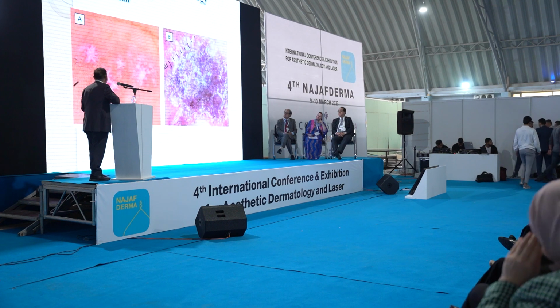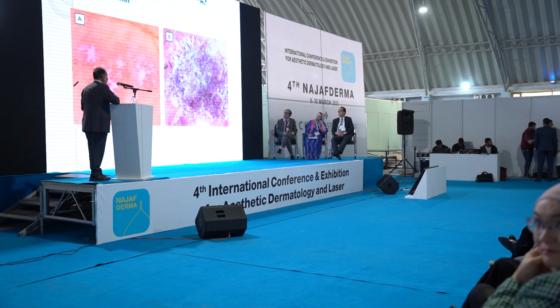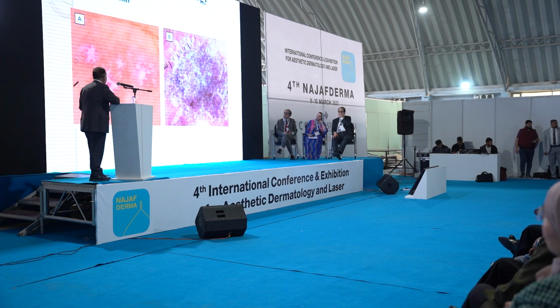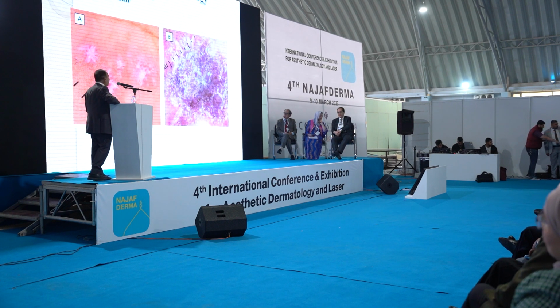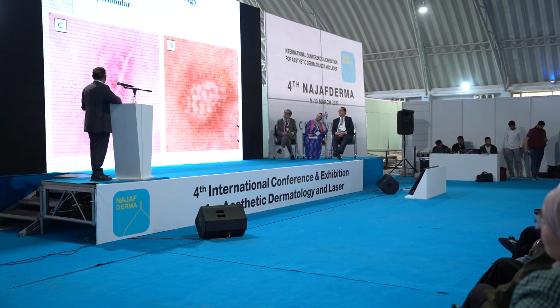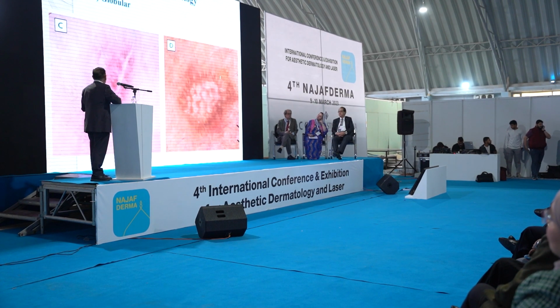Again, radial streaming of Wickham striae, picture on A, instead of the reticular configuration, which is characteristic of Wickham striae, which you are seeing on the picture B. Picture A shows us radial streaming. Okay, the D is characteristic.